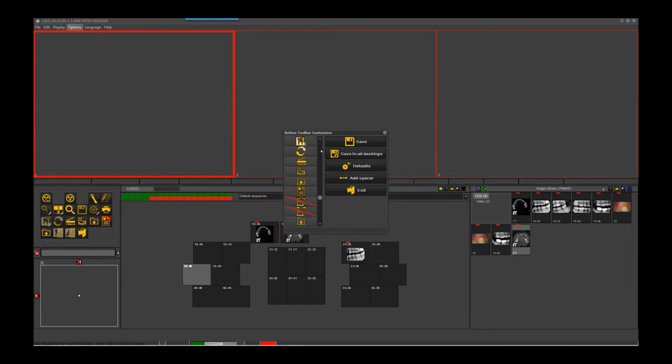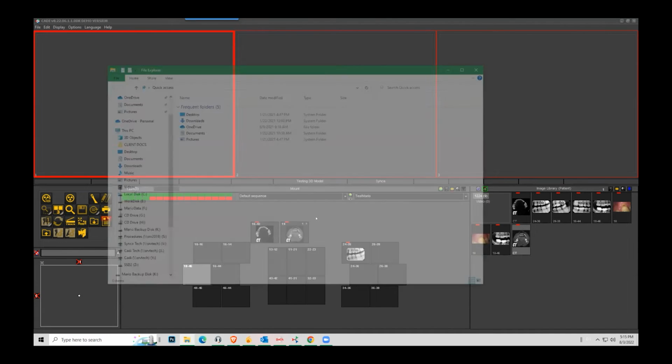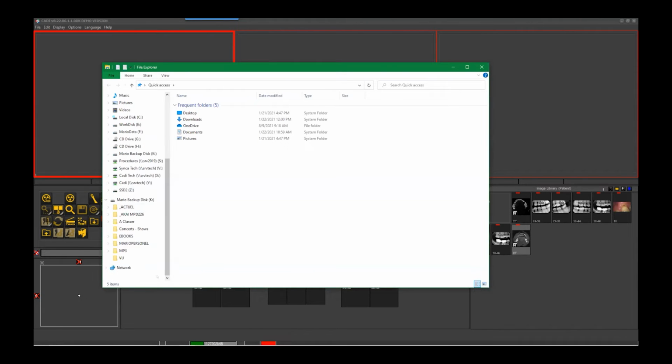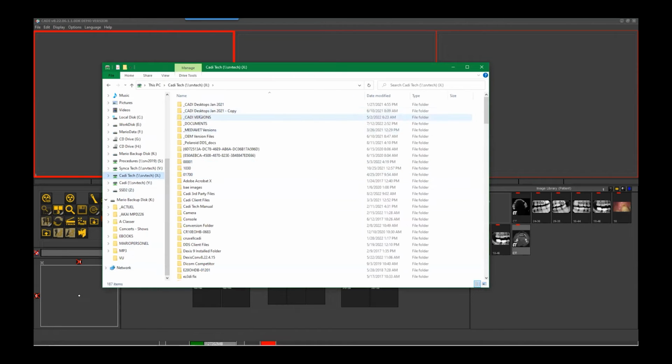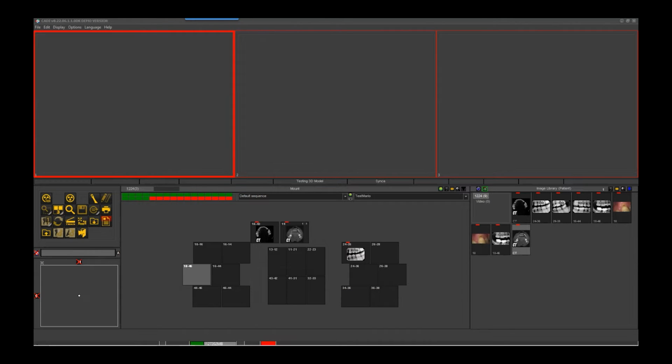Ortho tracing, when you say the word tracing, I don't recognize that in the verbiage that we're using it in. What does that look like? Well, when they're tracing out the plan, the treatment plan. So like creating it? Yes, I think you're going to recognize it when Mark pulls it up here in a second.